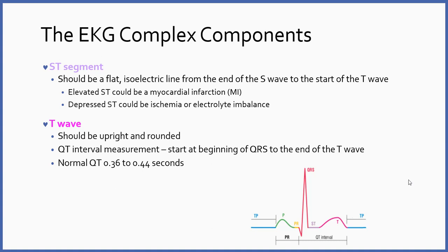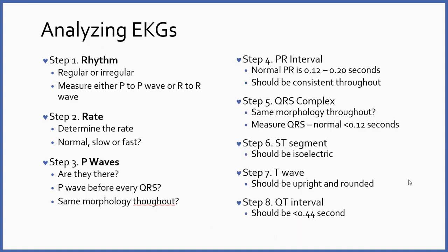All right, so we're going to be making some measurements. Now let's start putting things together to analyze.